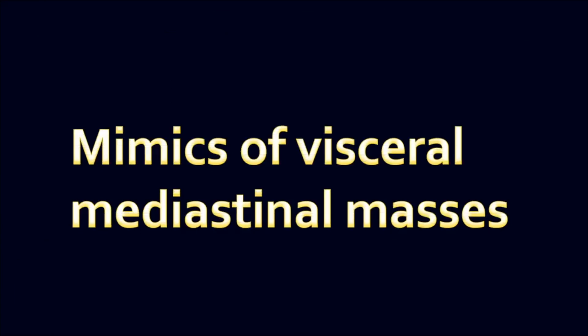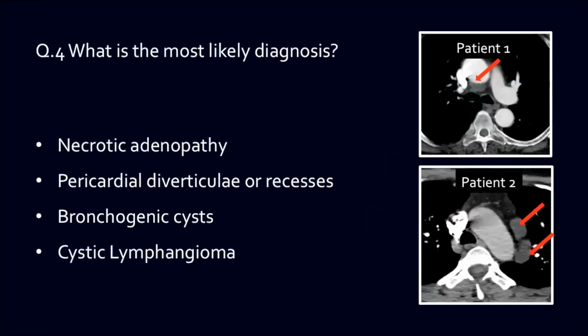Now, last, I would just want to share some mimics of visceral mediastinal masses. And I'm sharing images from two patients, and you can think of the possible diagnosis here.